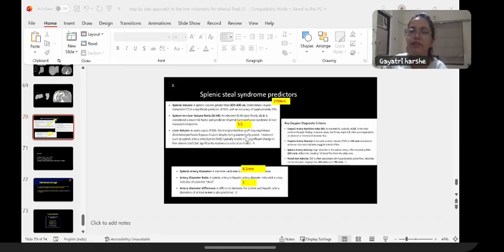And as I said, the segment 4 artery origin is more important. If it is a left lateral segment graft or a left lobe, and the segment 4 artery is arising from the right hepatic artery or right anterior hepatic artery, then that can be one of the reasons for rejection, because there will be more ischemic area in that case.